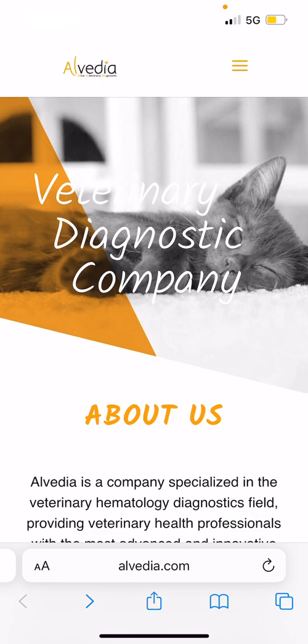We are proud to present the launch of our new application, the Alvedia Test Reader. So we are going to start by demonstrating how to download this application onto your mobile phones.